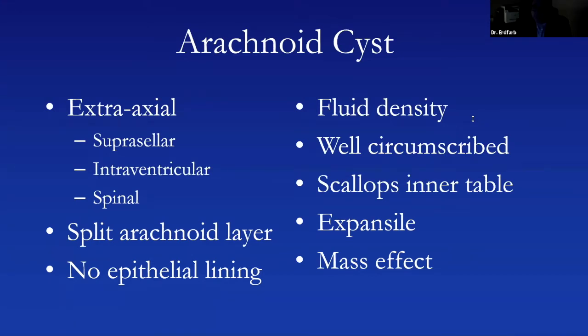It would be very different if there were enhancing components. If you saw a lot of edema around it, if you saw destruction of the brain, you'd be thinking about something else. The most important thing to recognize about the arachnoid cyst is that it's not a slam dunk, though. You can have a homogeneous CSF intensity or CSF density lesion in the extraaxial space, and it's not always an arachnoid cyst. On CT, we tend to call it as such.